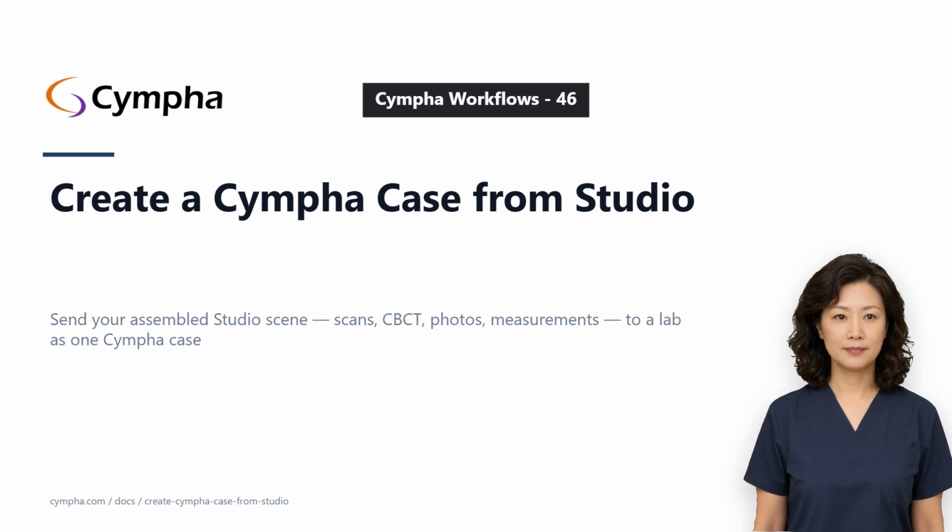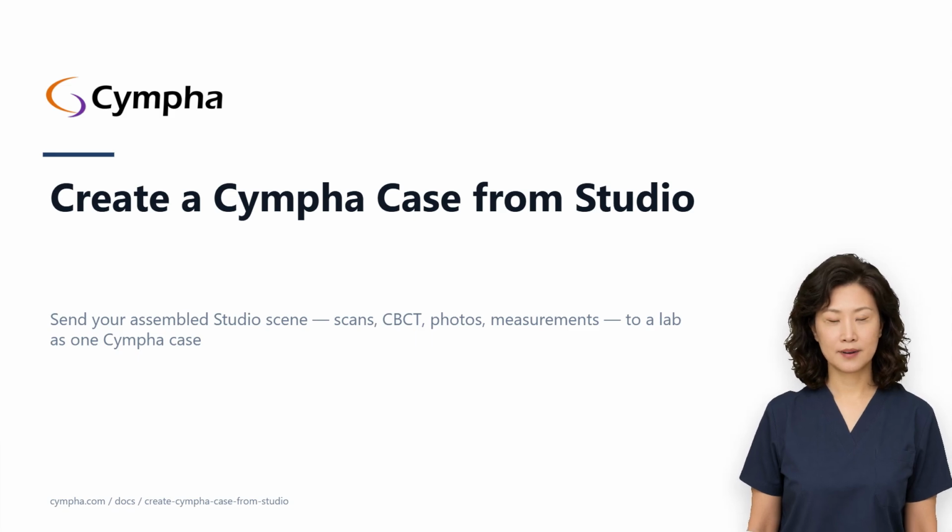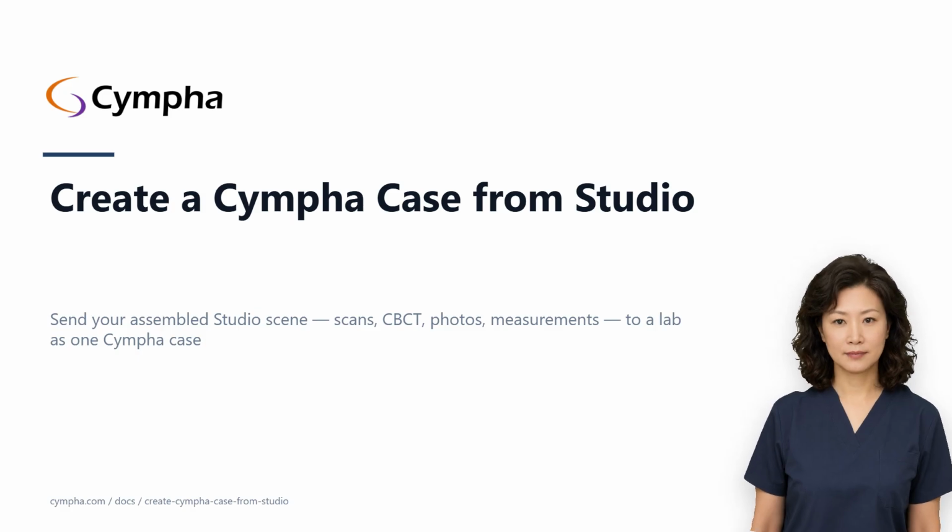Welcome to Guide Mia. Today we're going to talk about creating a Cympha case directly from Cympha Studio. This one is for the clinician who has assembled a patient's scans, CBCT, photos, and annotations in Studio and wants to send the whole thing to a lab in one action, instead of downloading files locally and re-uploading them. By the end, you'll know how to assemble the virtual patient, package it with the Create Cympha Case menu item, find a lab and submit, and where the case appears on app.Cympha.com once it's in.